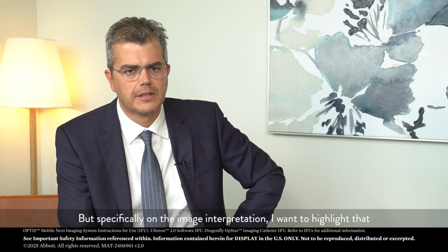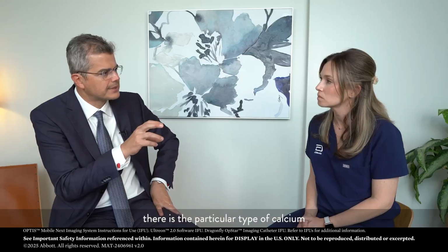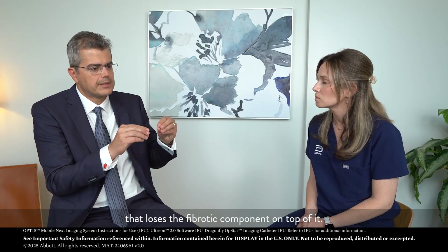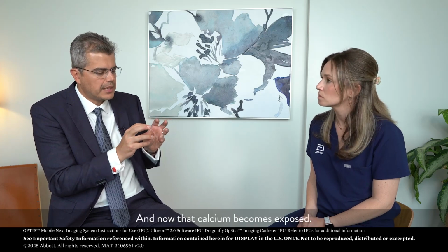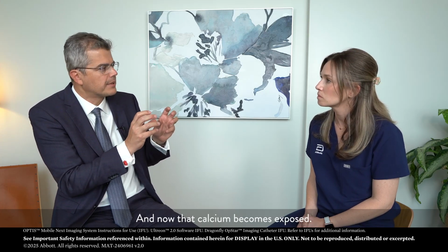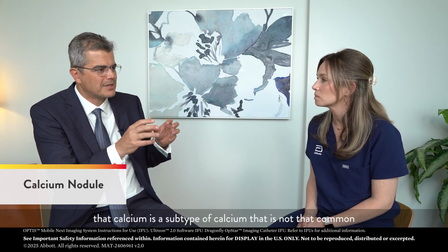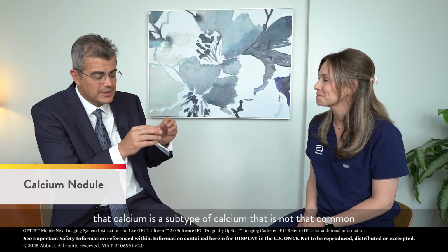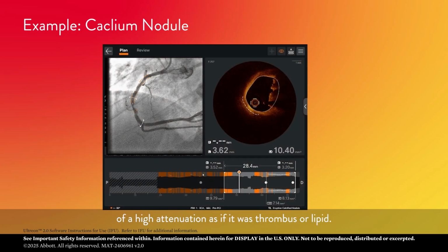But specifically on the image interpretation, I want to highlight that there is a particular type of calcium that loses the fibrotic component on top of it, and now that calcium becomes exposed. That's what we call the nodule of calcium, and that is a subtype of calcium that is not that common, but you might misinterpret that calcium because of a high attenuation as if it was thrombus or lipid.